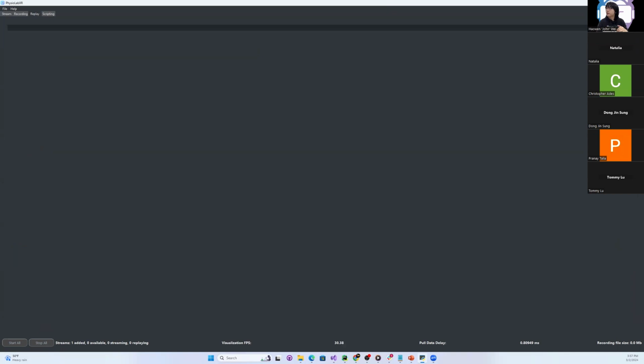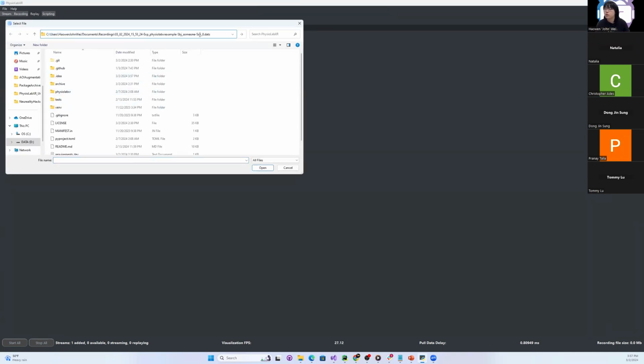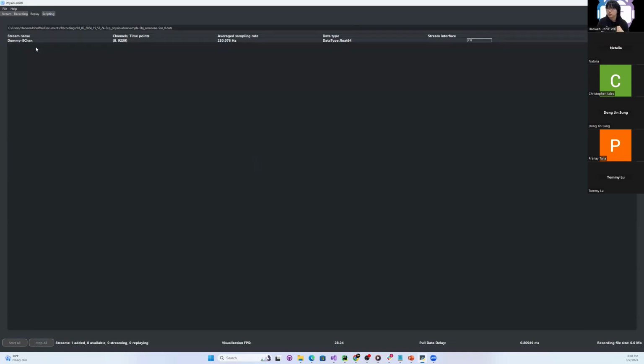And in the replay browse, let's find the directory. So it's right here. And so we got this recording file. It's called PhysioLabXR example. Okay. So I select it and I open it. Perfect. So once you open the recorded file, you will get this.